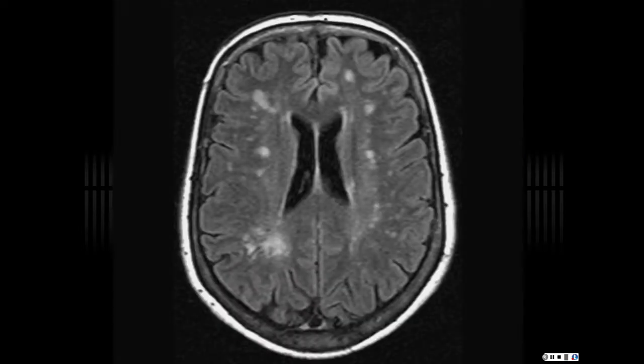In this patient, again, this is another FLAIR image. We just see all these spots and dots. I see these all the time. In fact, everything now is voice recognition, so when I dictate, my words come up and I just sign right there. We used to have transcriptionists typing up our reports. I have a dozen reports that I can just hit a button and they populate a whole study. I have a macro. I have an automatic study for this. I see this more often than I see totally normal cases.